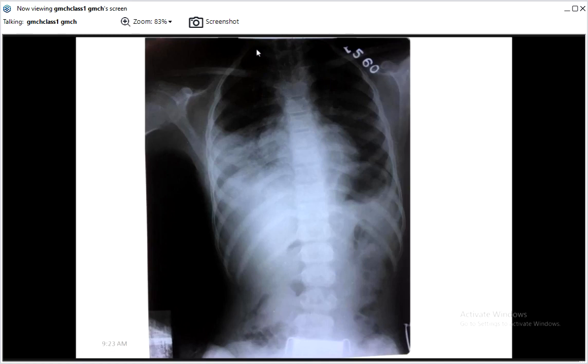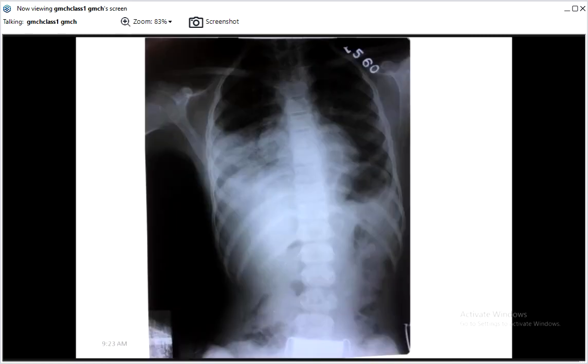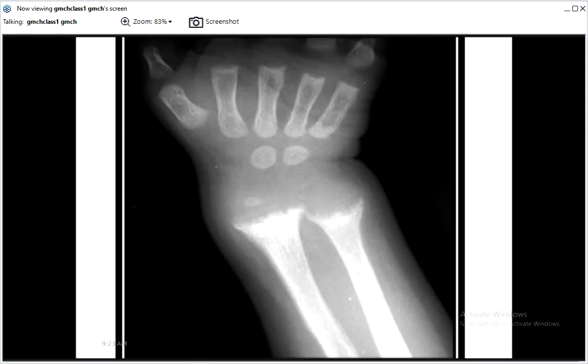Here again in this X-ray, this is also a similar X-ray. Okay, the disease process is evolving. You can see the right costophrenic angle. You cannot visualize that. That is blunt, and there is a radiopacity in the upper area, which is showing air bronchogram. So this is the consolidation. The disease process has led to the pneumonic effusion. So this is pleural effusion with a consolidation. Okay, so these are the chest view X-rays which are lying there.